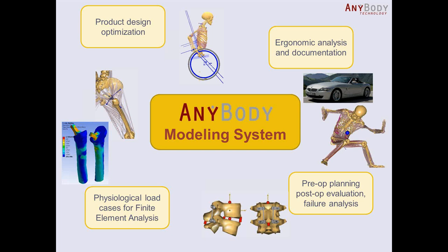or you can use it for hip replacements, knee replacements, or any similar case. The last field here is you can export all these complex loading scenarios on bones or on devices and import them into finite element analysis. So for example, here you see during Gait or during different activities, you can export the loads acting on a femur and analyze them in a FE tool.